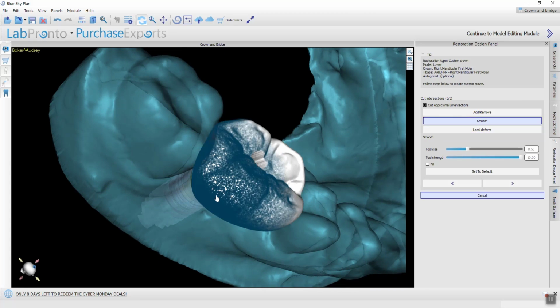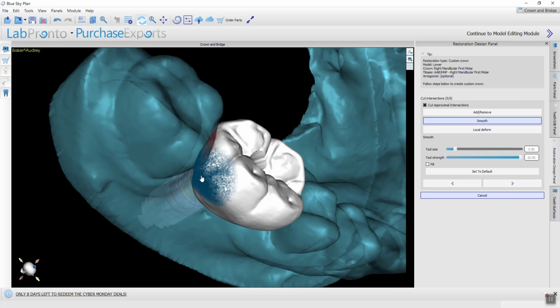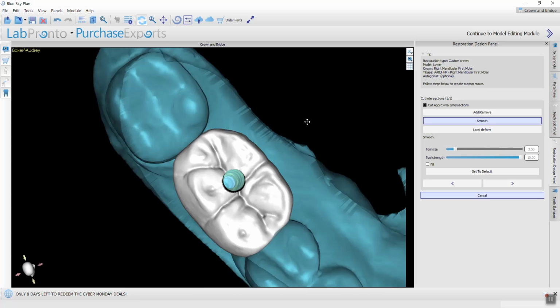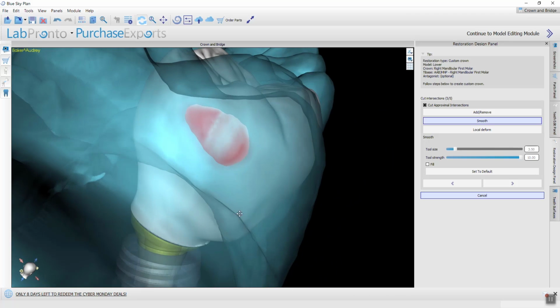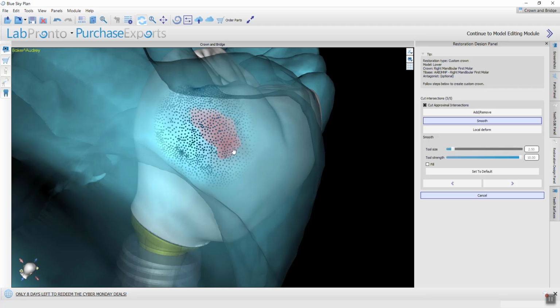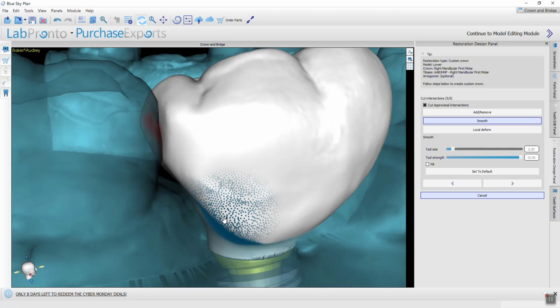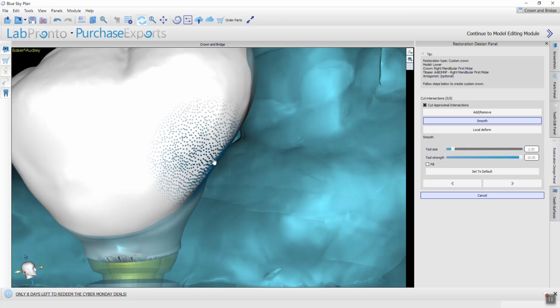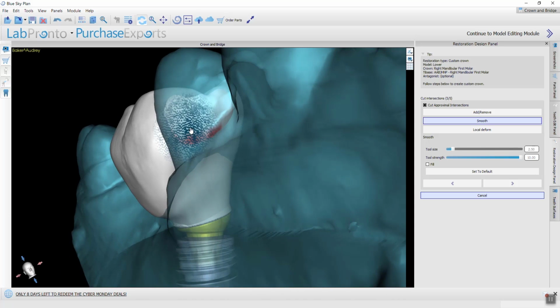Okay, so I'm going to just grab my tools. There you go. If I want to change my interproximal surface, I just have to hold shift, left click with the mouse button, and I always like to have just a little bit of protrusion to have a very tight contact. So you can adjust it clinically when you have the crown. And now, same thing on the other side, on the mesial.